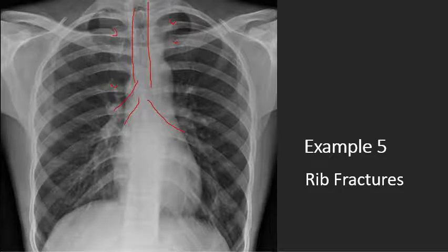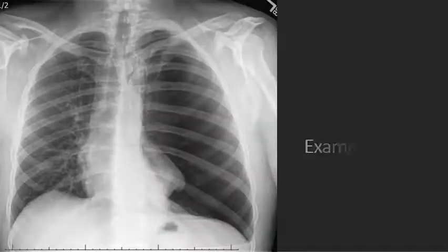you don't want to look at here and say, oh man, what's going on here? Well, remember, X-rays go through things, and so it may appear as if these bones are being withered away. But if you do have some high suspicion of some type of cortical destruction from cancer, that's something that you need to get a CT for. So let's move on to this one.